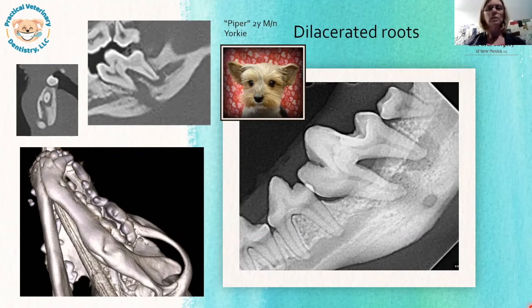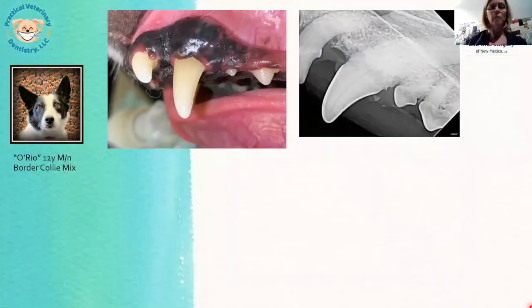You could kind of see it on the radiographs, but this just gives it much more visibility that really helps the owners as well as helping the veterinarian make a better plan.